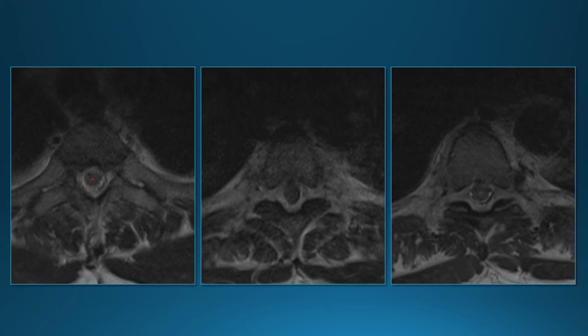And then in the middle slice where this epidural phlegmon is, the spinal cord is flattened from side to side and expanded from front to back, and then lower down we can see the spinal cord going back to a relatively more normal shape. So one pitfall on looking at sagittal images is you can have cord compression on the sides that makes the spinal cord look fatter from front to back, and without looking at the axial images, you might not appreciate that there's actually cord compression, in this case due to an epidural phlegmon.